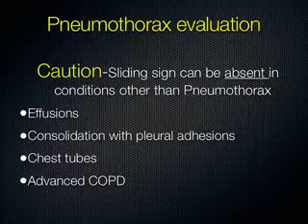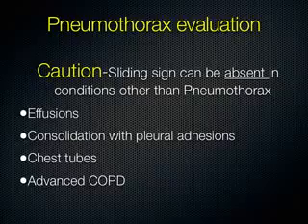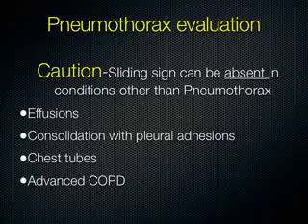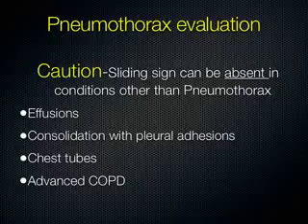But you would still be able to see B lines. You would still be able to see a little bit of motion when you go on M mode. You would still be able to see that. Seashore sign should still be there. But lack of sliding, be careful. If you see lack of sliding, don't make your diagnosis just on that. Okay? All right, we're going to move on to fluid.